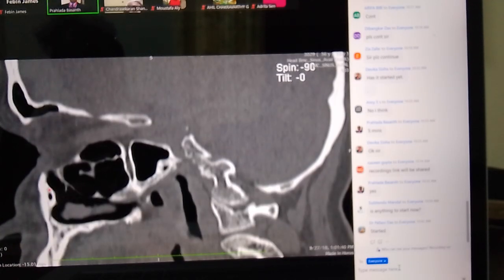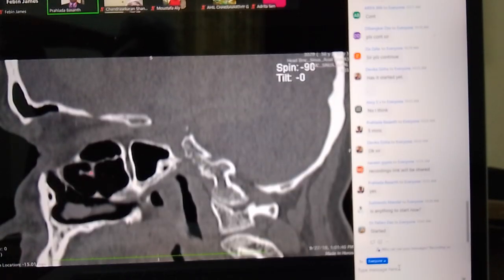Let's see. We go further as we go. We understand this. Yeah, this may be the lacrimal canal. Okay, this is the inferior turbinate. This is the inferior meatus, and this is the middle meatus. Okay, medial wall. Further medial to the nasal, this is nasal cavity. Okay, nasal cavity, and this is the palatine canals. Okay, and this is the eustachian tube, and this is the posterior choana, nasopharynx, and that's where the fossa of Rosenmuller opens, and this is the superior orbital fissure with the optic canals.